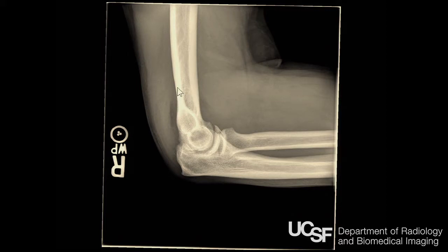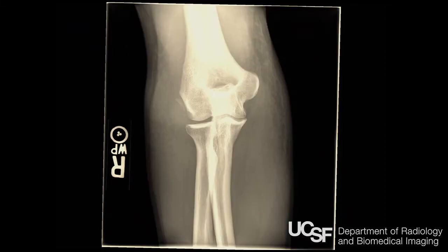Here's another one, posterior fat pad, sail sign. This is a place you always should look. Right here, this is the coronoid process, and there's a little avulsion, a real common fracture, and it's easy to overlook. It may be only visible in this lateral radiograph. Make it a point to look here on every elbow radiograph for these little avulsions off of the coronoid process. It may be a sign that the patient was dislocated and then reduced. Here is the AP radiograph, I can't see it.